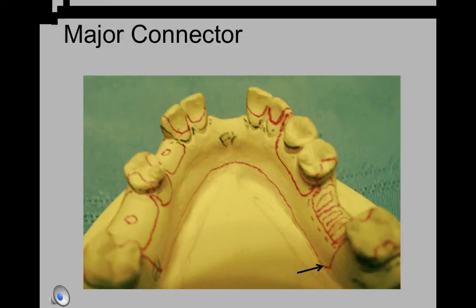There are also rules as far as placement. You do not want to place that superior border along the gingival margin, as it will pack food down into the sulcus and the tissue may be stripped away in that area.